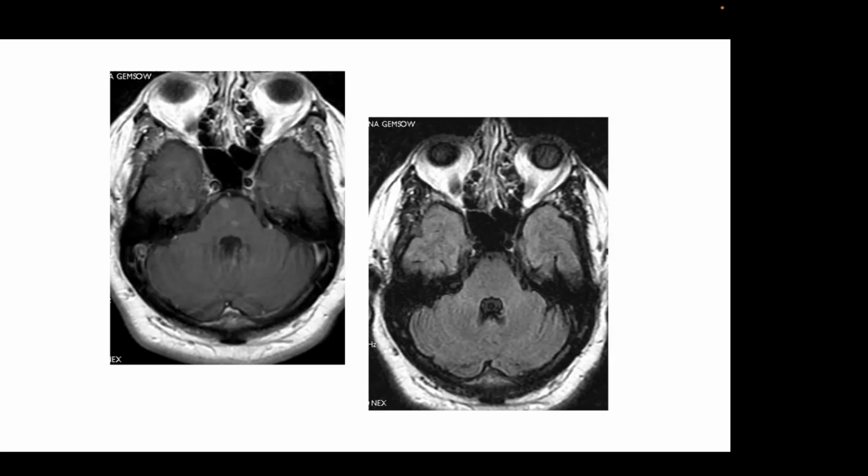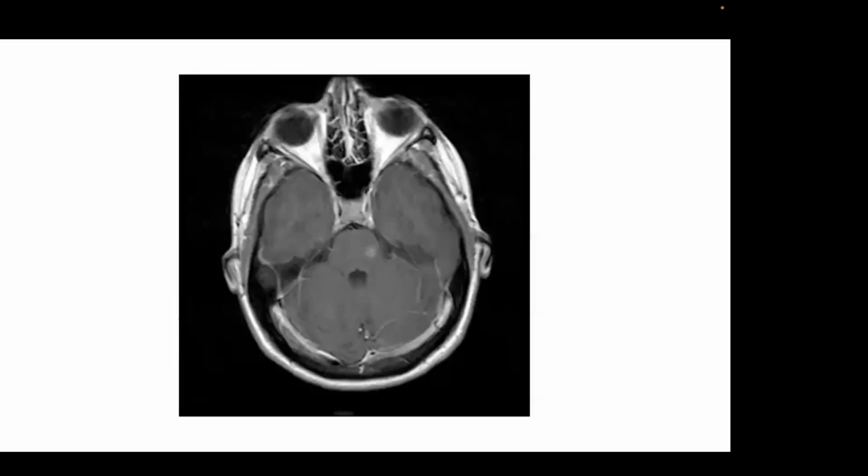As you know, the vasogenic edema that we usually associate with metastatic disease is often absent when you're dealing with lesions where there is dense fiber packing. For example, you can see that in the brainstem. You also see that in the cortex because of the tight neuronal packing. It seems as though it limits the degree of extension of vasogenic edema.